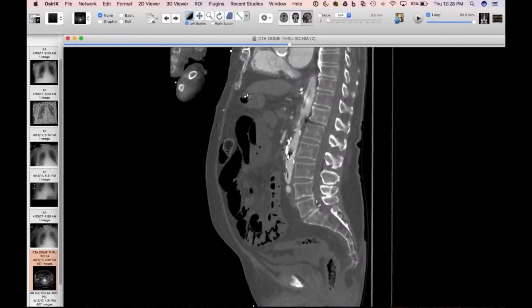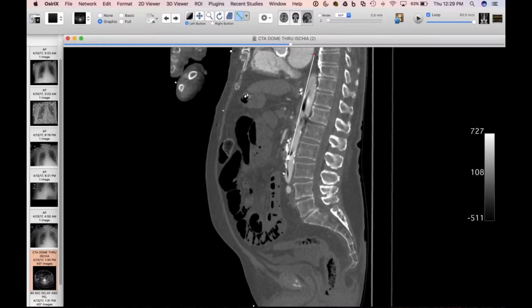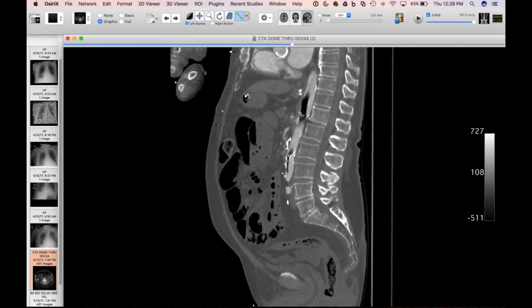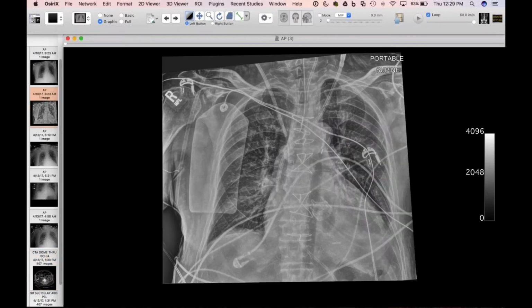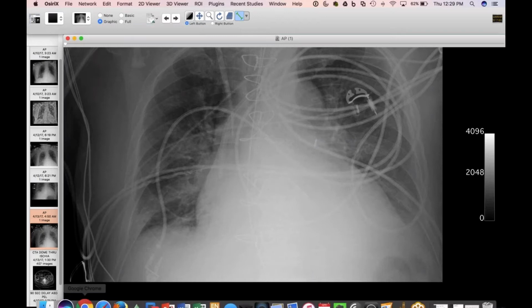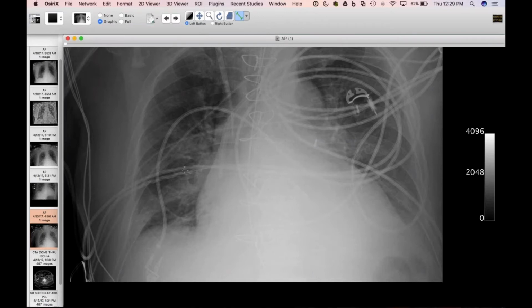We can figure out where the tip is right here. I think this is what you're saying, and then just measure up and see. That's 22. Mm-hmm. So it goes another 3 centimeters off of this image, and really then it would need to be about, I think the celiac is here, so 9 centimeters too low. I don't know. Maybe he's just a smaller guy, because assuming that it's similar to this, the 9 centimeters is going to put you somewhere up there. Right. So maybe he just doesn't have 25 centimeters from his arch down to his mesenteric vessels.